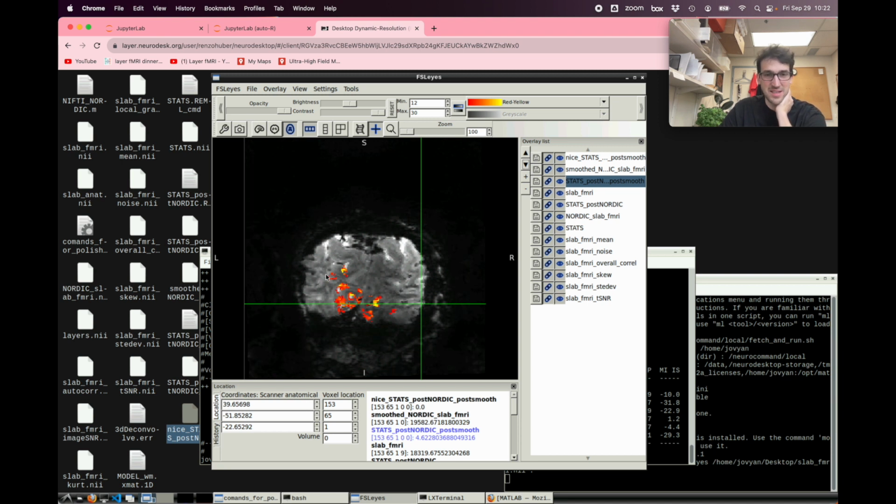So we have some patches that seem to be clearly activated, some patches disappeared, and this looks nice and clean, and convinces myself that we do have statistical activation, actually not only in this patch where it was kind of obvious before, but maybe also specifically in that patch. And in some of them, I'm still not sure if there's something going on at all. And with this, we are done with the second hands-on, and I thank you for your attention.